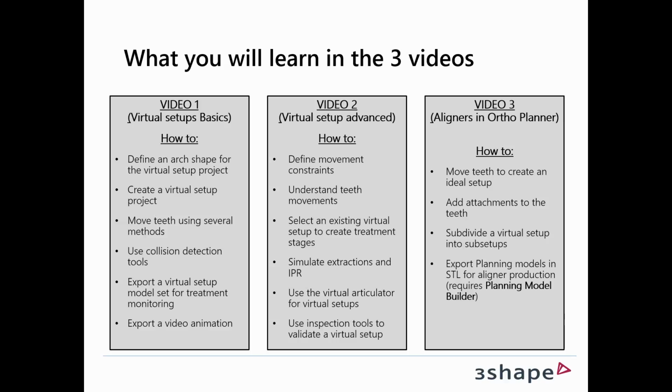And then the final video is more focused on creating aligners in the Ortho Planner module. That will teach you how to move teeth to create an ideal setup, how to add attachments to the teeth, how to subdivide the virtual setup into sub-setups, and how to export the planning models in STL for aligner production. And as I said, that requires the Planning Model Builder.